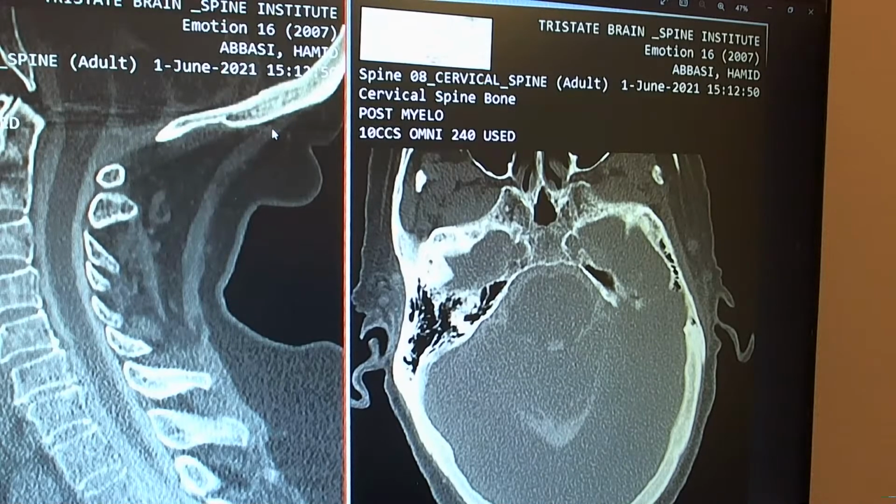We have two sternocleidomastoid muscles. They go on both sides. You won't really see that in this middle cut. And obviously, sternocleidomastoid goes in the front, connecting to the sternum, so it wouldn't turn around and go back.